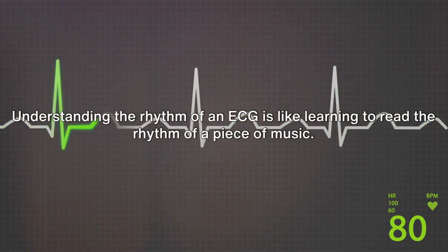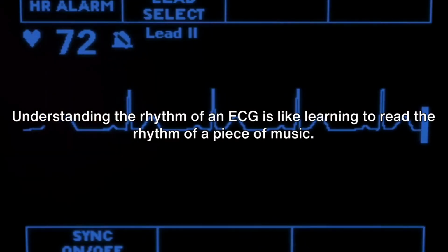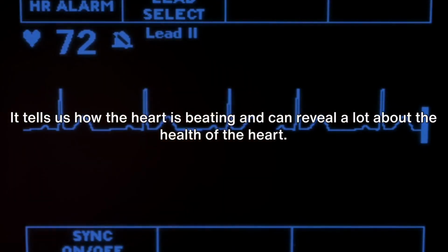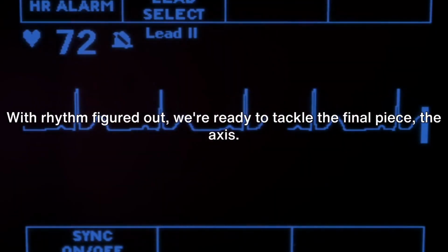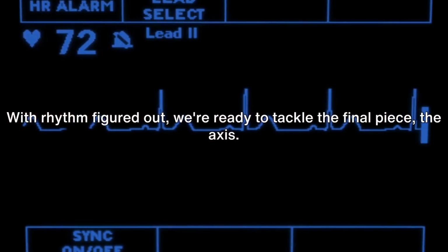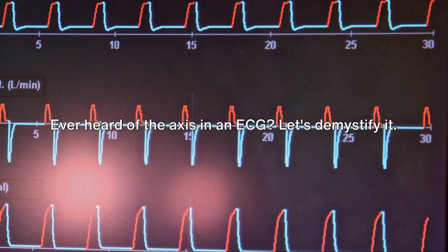Understanding the rhythm of an ECG is like learning to read the rhythm of a piece of music. It tells us how the heart is beating and can reveal a lot about the health of the heart. With rhythm figured out, we're ready to tackle the final piece, the axis. Ever heard of the axis in an ECG?